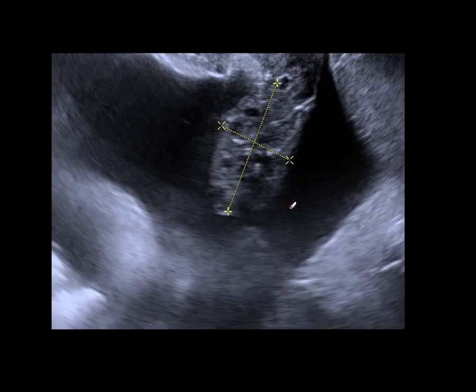Here's a patient who had normal ovaries. I just want to emphasize how you can get things wrong in your colour flow assessment. Unfortunately I don't have any pictures here without the calipers on, and I always tell people it's really important to try and take some pictures with the calipers off, so that people who might review your scans in the future can get a good look at them without these irritating markers on.